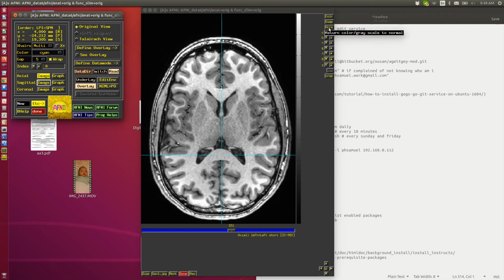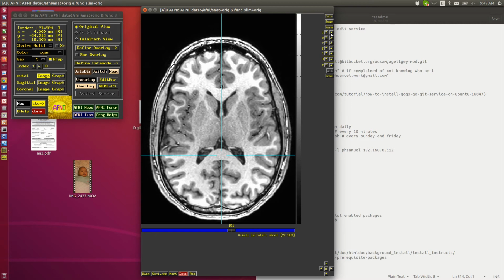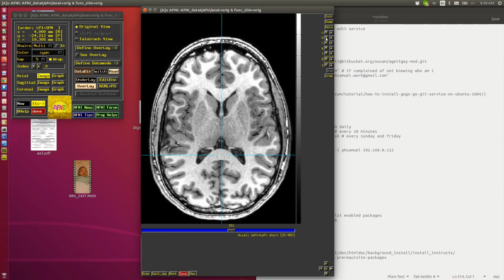C and B, contrast and brightness. Very good. If you click C up, it should change the contrast quite dramatically. If I click B down, it changes the brightness down, like that, for example. Now, if I screw it all up, I get it really weird.